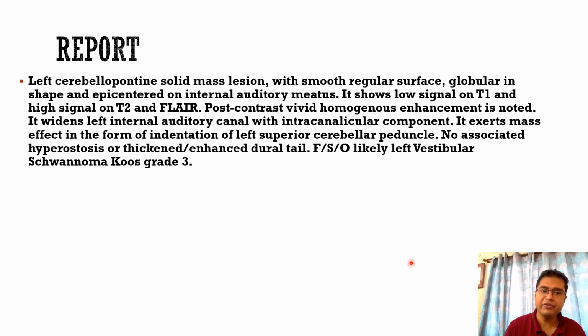It widens the left internal acoustic canal with intracanalicular component. It exerts a mass effect in the form of indentation of left superior cerebellar peduncle. There was no associated hyperostosis or thickened enhanced dural tail, suggesting a vestibular schwannoma, Koos grade 3.